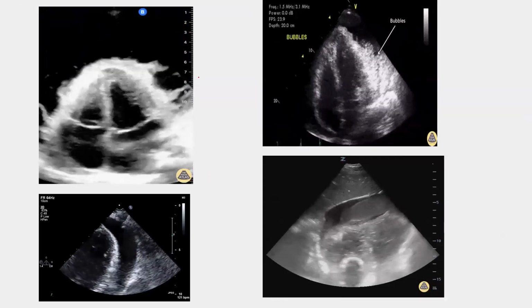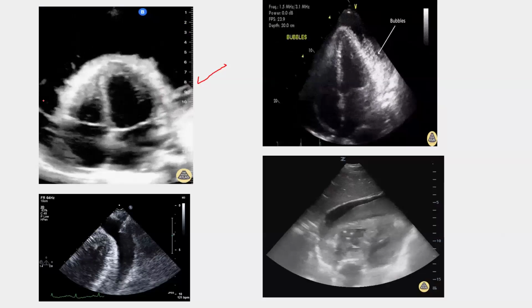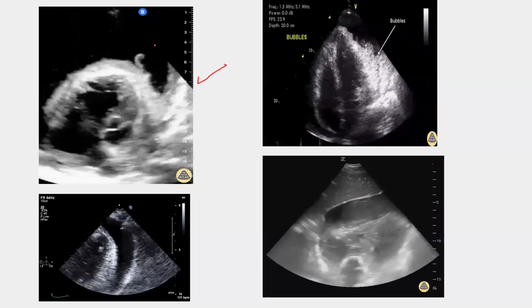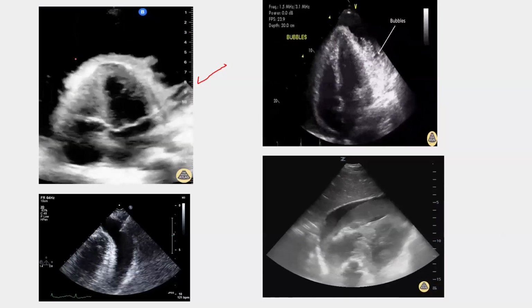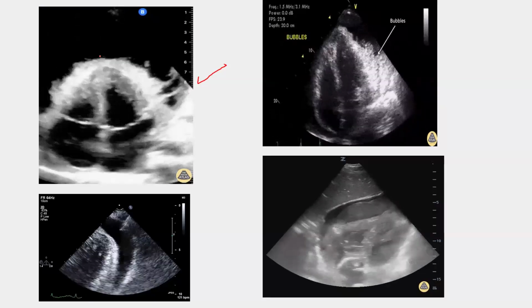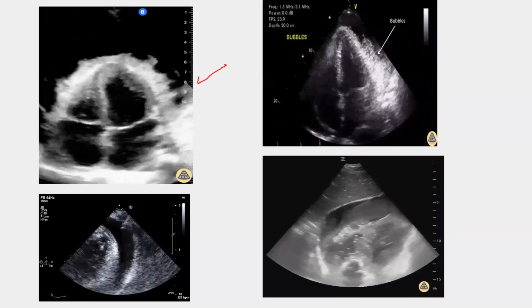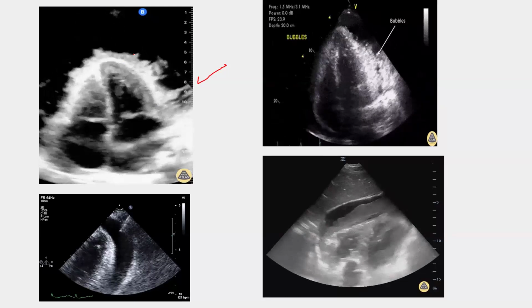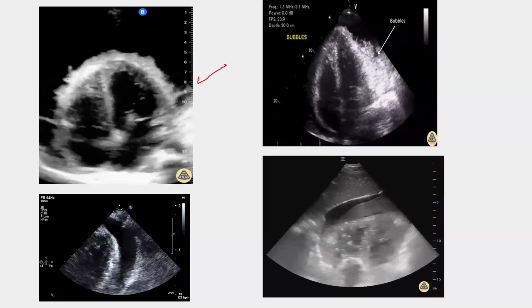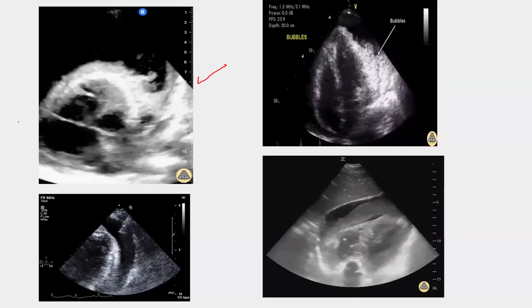What about this one here? This is large pericardial effusion. But what characterizes this pericardial effusion? Something very impressive about it, which is what? Loculated with fibrinous bands. Exactly. These are fibrous bands, okay? And we have said it before.